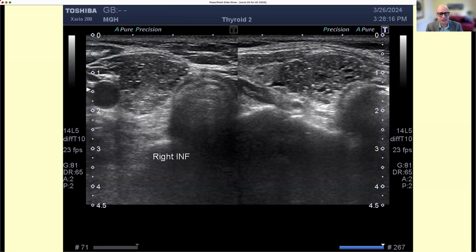We as endocrinologists, I don't know if you're all endocrinologists, do like to do live ultrasound, as opposed to the radiologists, who get images taken by technicians. That is because you lose at least 30% of information by looking at still images. Unfortunately, in this particular setting of the lecture, we can only look at still images, so there is a limitation here. Some of the interpretations may be made difficult by the fact that we're looking at two single frames that don't give the whole story. But anyone willing to describe this nodule?